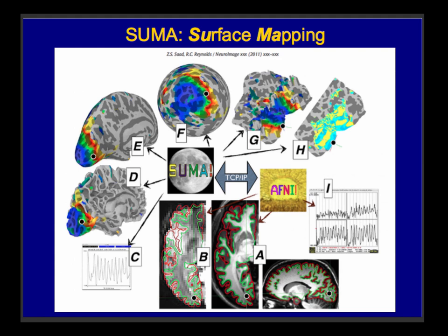But everything that Bob talked about, all the statistics and things like that, all that is kind of the same. Instead of thinking about voxel by voxel, these cubes in space, as you can see here, this granularity, what we'll talk about now are these nodes, because what is our surface? We'll take a little more look at it, but it's a mesh. So we have these nodes connected in space.